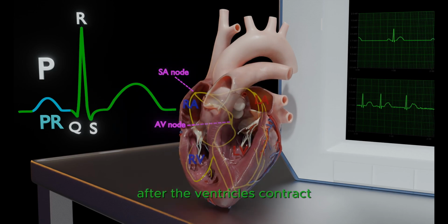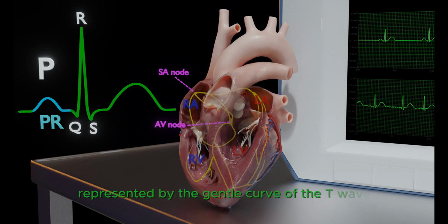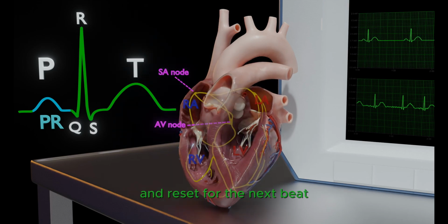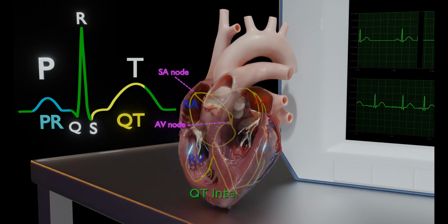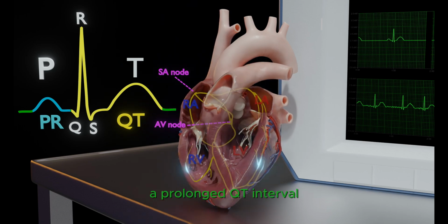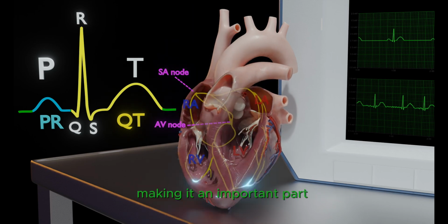After the ventricles contract, they need a moment to recharge. This recovery phase is repolarization, represented by the gentle curve of the T wave. Think of this as your heart's moment to take a breath and reset for the next beat. The T wave is part of a larger interval called the QT interval, lasting roughly 0.36 to 0.44 seconds. A prolonged QT interval can signal risk for dangerous heart rhythms, making it an important part of the waveform to watch carefully.